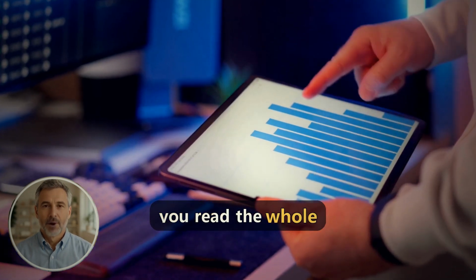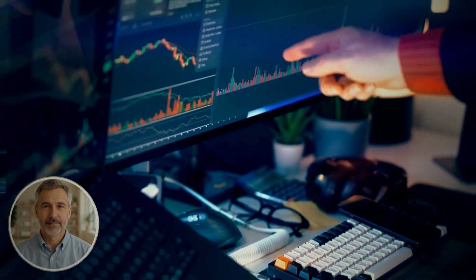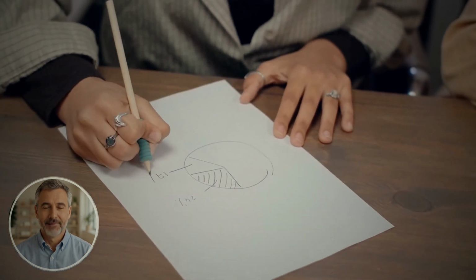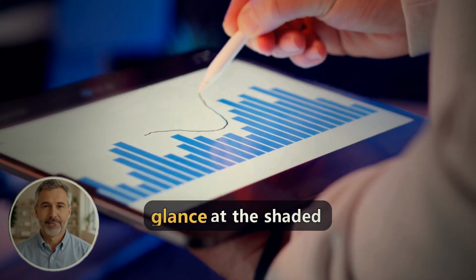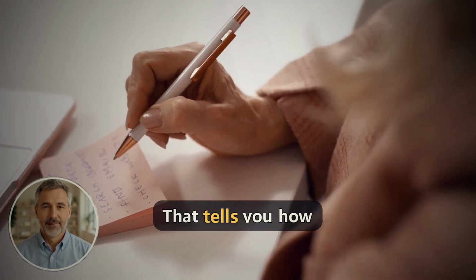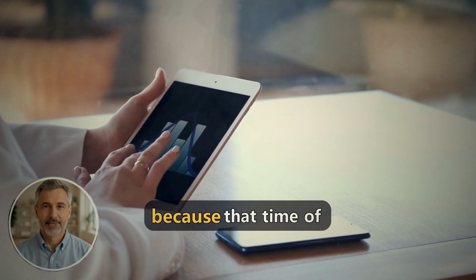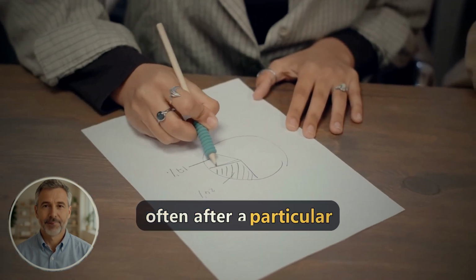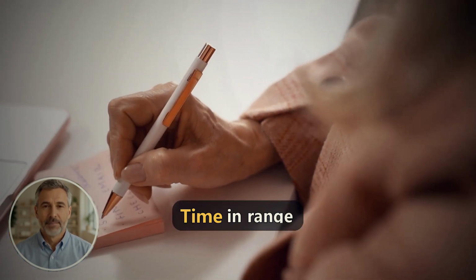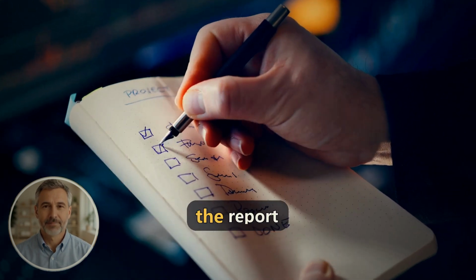So here's how you read the whole thing in 30 seconds, in order. First, time in range. Are you above 70%? And is your low time under 4%? That is your headline. Second, glance at the shaded band. Is it tight, or is it wide and all over the place? That tells you how steady you are. Third, check where the middle line climbs the most, because that time of day, often after a particular meal or in the early morning, is your best clue about what to adjust. Time in range, then spread, then the biggest climb. 3 looks, and you have read the report.